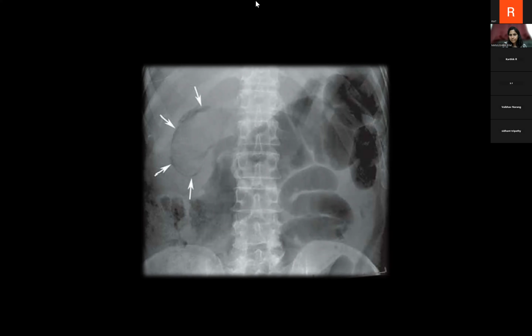Time is up. Okay. Purvita has answered it correctly. I think because of being in a hurry to answer first, only short forms are coming. Okay, so this is emphysematous cholecystitis only. Here this is a radiograph where we are seeing the lucency outlining the gallbladder. So this is basically intramural air within the gallbladder, which is suggestive of emphysematous cholecystitis.